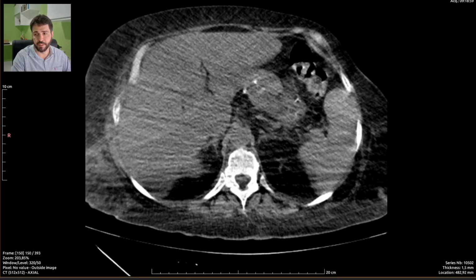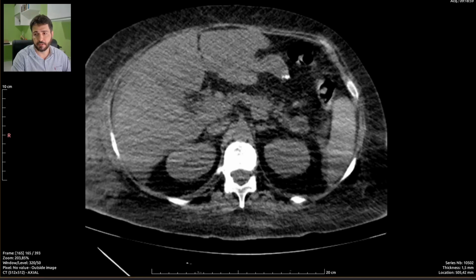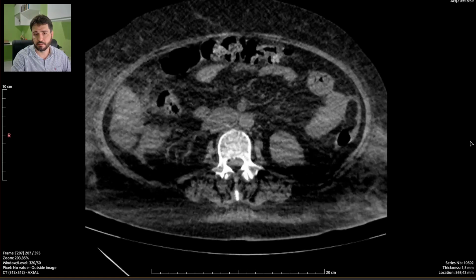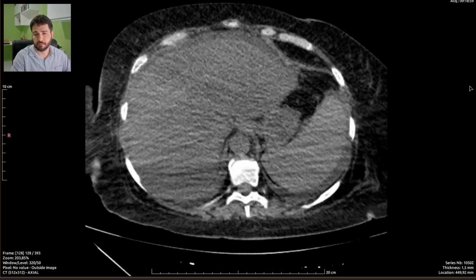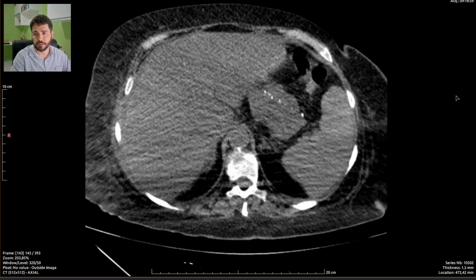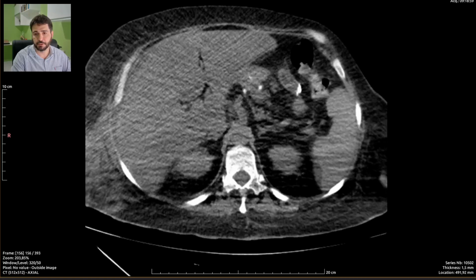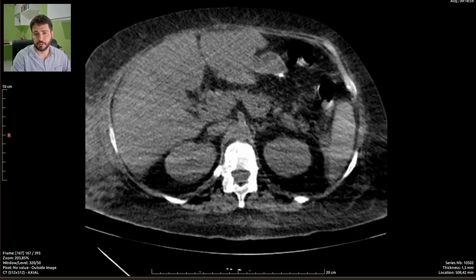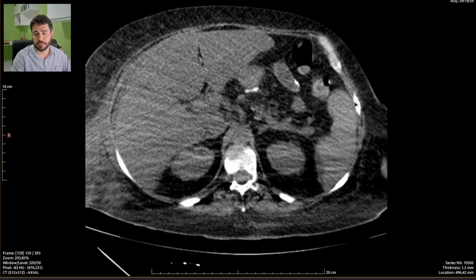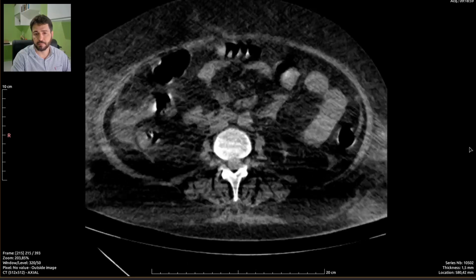I don't know if you guys have noticed it. This patient is a bariatric surgery patient. There is clearly a gastric surgery here, which is a very common gastric bypass morphology. So this is the gastric pouch, the feeding limb, and this is the left out gastric remnant.